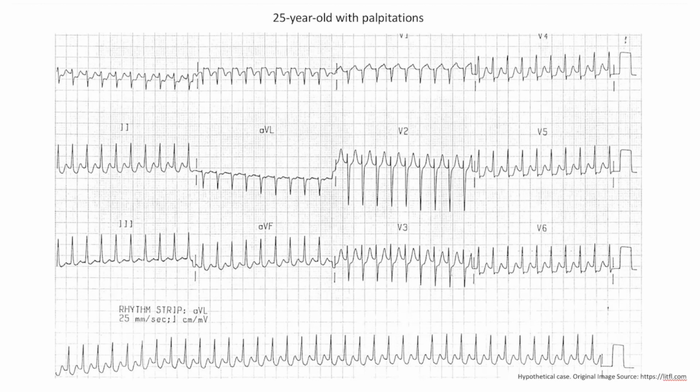So, after hearing all this, you might be confused about how you can reliably differentiate between, say, atrial tachycardia, atrial flutter, AVNRT, AVRT, and so on and so forth. It looks like on certain EKGs, it might be impossible to differentiate between, say, AVRT and AVNRT. An EKG by itself would not help you answer these questions.